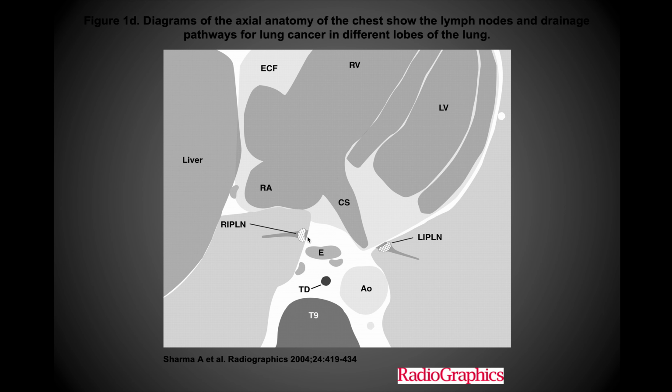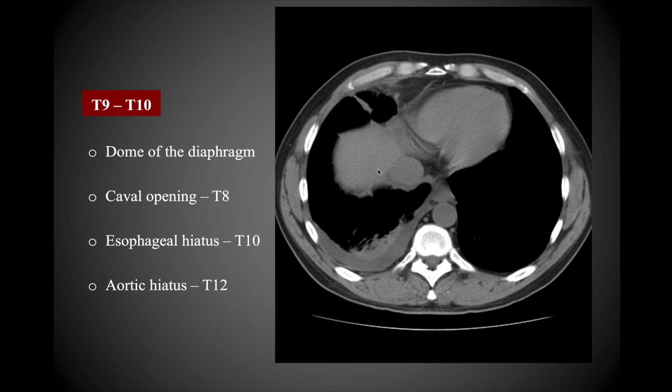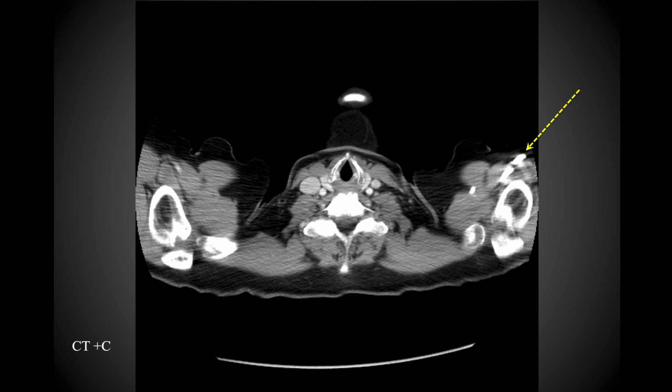Once again, you have some additional lymph nodes that you can appreciate at this point, esophagus, descending aorta. Again, thoracic duct you won't see very well, but in some cases you'll be able to start seeing the liver at this point as well. So again, this is still probably the dome of the diaphragm, but in some other images you'll see where we start getting into the actual liver parenchyma at that point.